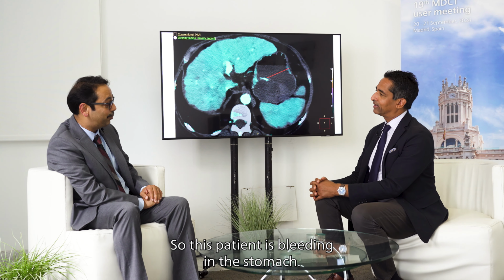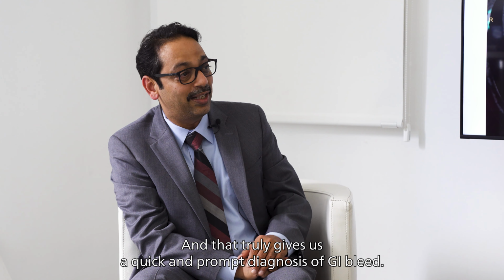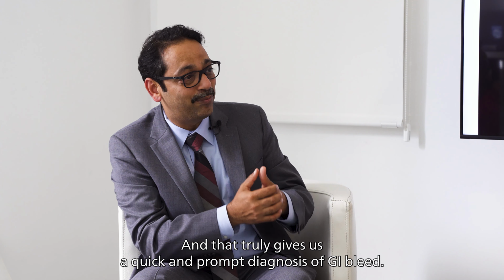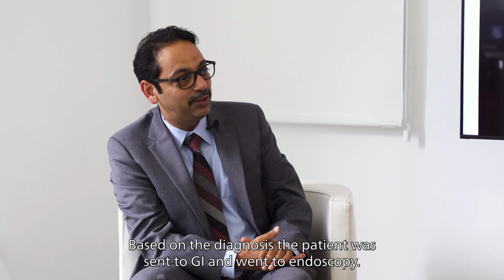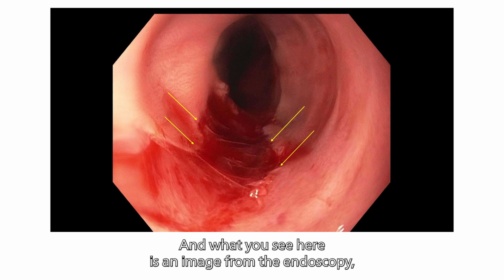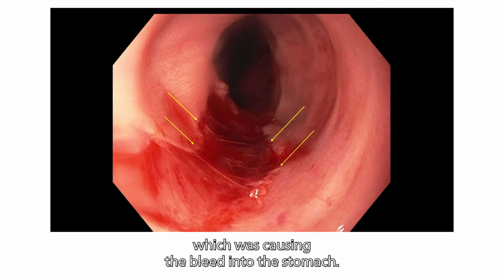Yeah, so this patient is bleeding in the stomach, and that truly gives us the quick and prompt diagnosis of GI bleed. Based on the diagnosis, the patient was sent to GI, went to endoscopy, and what you see here is an image from the endoscopy which shows a large Mallory-Weiss tear in the distal esophagus GE junction area, which was causing the bleed into the stomach.